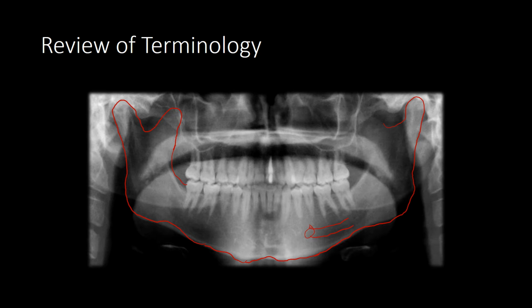That's pretty much it. I'd also like to point out this part of the mandible you can call the crest or alveolar crest. And again, many of the fractures extend all the way to this region, so that's a good landmark to know.